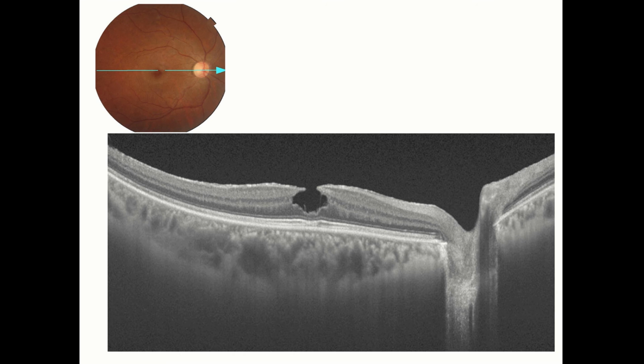This is a patient with an altered foveal reflex, and if you see, the foveal area is split and there is an irregular area of cavity formation where the central area is deficient. So this is a patient with a lamellar macular hole. The other important thing you see is that the external limiting membrane is intact. The ellipsoid zone seems to be intact with slight fragmentation in the very subfoveal region. So if you do surgery, it might have a slightly better prognosis.